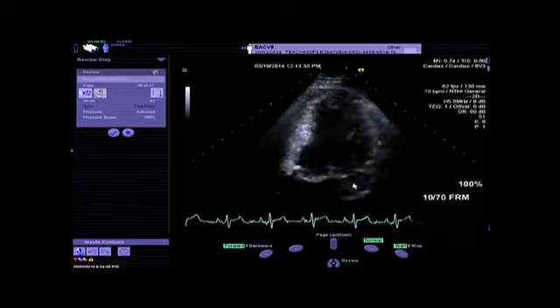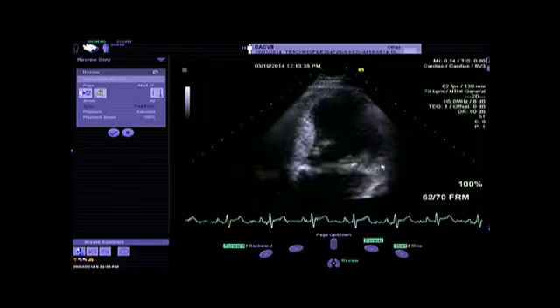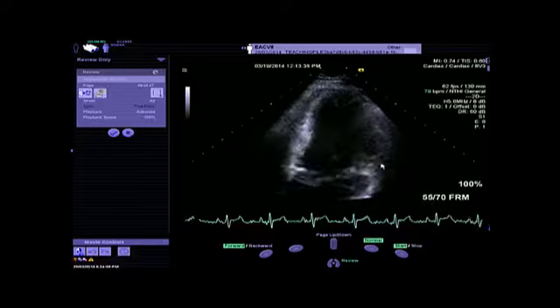of calcification, and we have some extensive calcification of the posterior mitral annulus also extending to the lateral wall, which will be associated with a high risk of failure of mitral valve repair in these patients. So the likelihood of repair is very low.